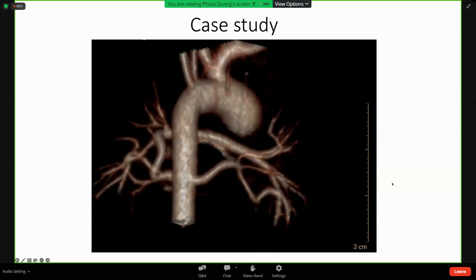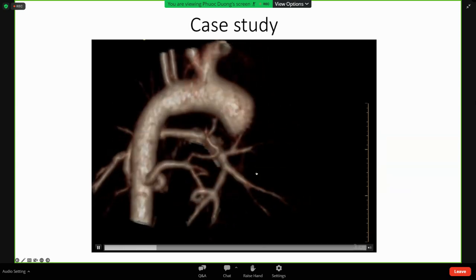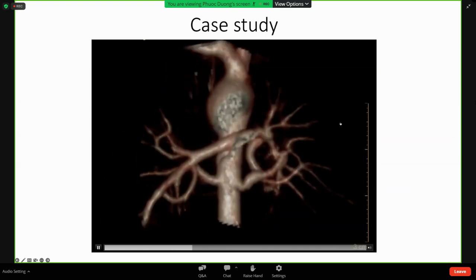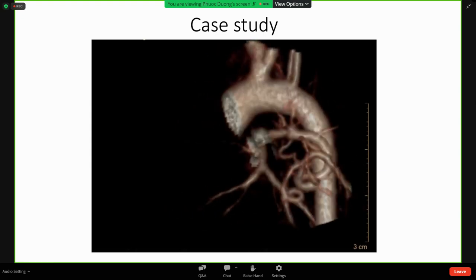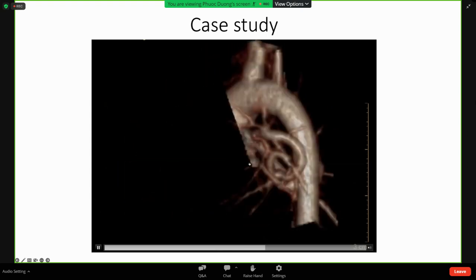I just want to show one other example, just to highlight the value of CT. This is a patient that I had a few months ago. The baby, less than 2 kilograms, was born with no antenatal diagnosis, with TOF-PA-MAPCAs as the intracardiac anatomy.